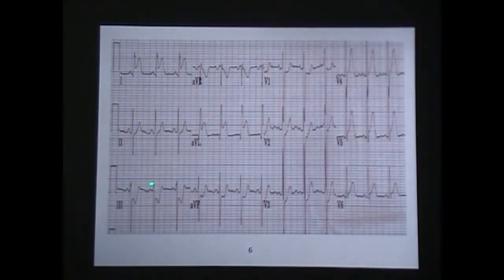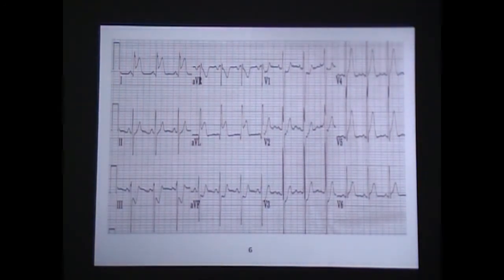It's tachy, it's not slow. So to me, with a really peaked, pointed T wave, I should be a little bit slower. So I might discount that to some extent. But we definitively have reciprocal changes down here. I've got a narrow QRS. I've got deep S waves though in the precordial leads. So what kind of injury pattern is that? Lateral. It's a lateral with reciprocal changes in the inferior leads.